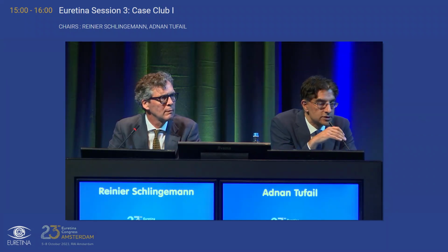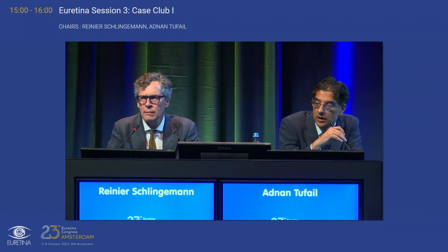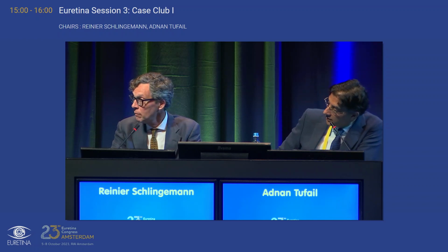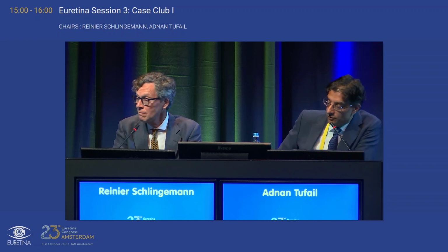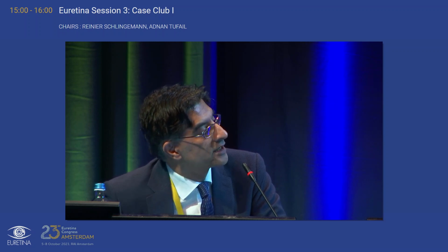Anyone in the audience who manages cases want to comment on MPS? Or co-panelists, any thoughts? Beautifully illustrated case. Anything else apart from MPSs that give you that broad ellipsoid zone region reflectivity? So in your differentials, anything else that will give you that? Any other deposition disorders?